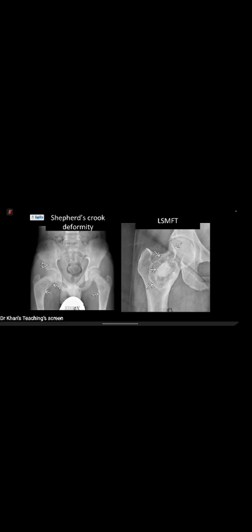So the lesion on the right used to be called a liposclerosing myxofibrous tumor. It's now thought to be on the spectrum of fibrous dysplasia. So just be aware that those lesions tend to occur in the intertrochanteric region or femoral neck, and you can see that densely sclerotic focus centrally, and they tend to be a little bit more well defined with a sclerotic margin. So you can see the differences with the two images side by side there.